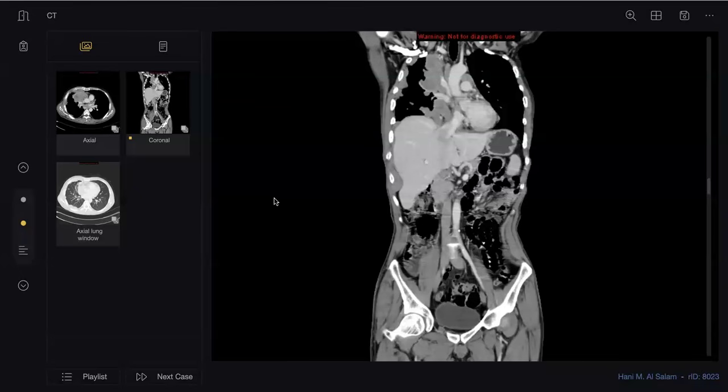Okay, so coronal is important in invasive thymoma and in malignant mesothelioma to check for involvement of the diaphragm and to check for subphrenic spread. If we talk about thymoma, can you think of any disease associated with it? Yes, it can be associated with myasthenia gravis. It can also be associated with pure red cell hypoplasia and hypogammaglobulinemia. Good, great, you did great.